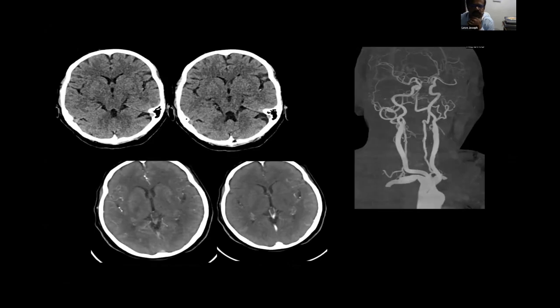Okay, another case, 45 years old lady, presented with sudden right-sided weakness. Okay, this case I think Dr. Ajay also showed. Can you recall the finding? Anybody? Sir, there is a MCA dot sign in the left MCA territory. Yeah.